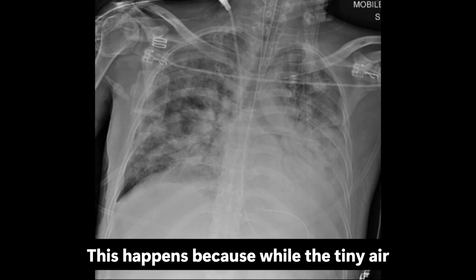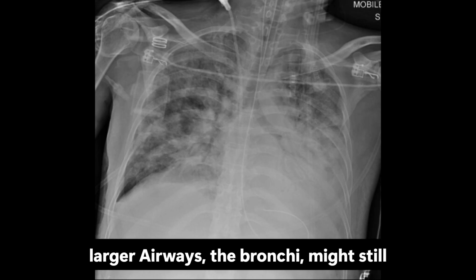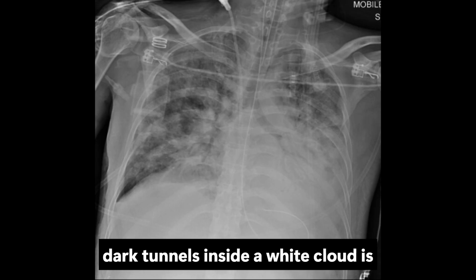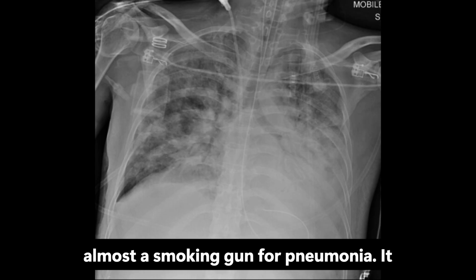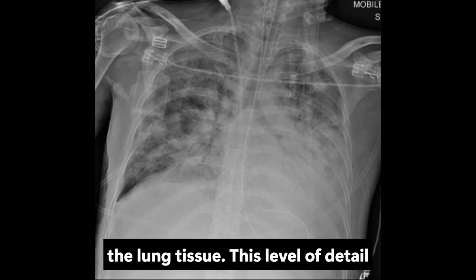This happens because while the tiny air sacs are drowned in fluid, the larger airways, the bronchi, might still have some air inside them. Seeing these dark tunnels inside a white cloud is almost a smoking gun for pneumonia. It tells us the infection is deep within the lung tissue.